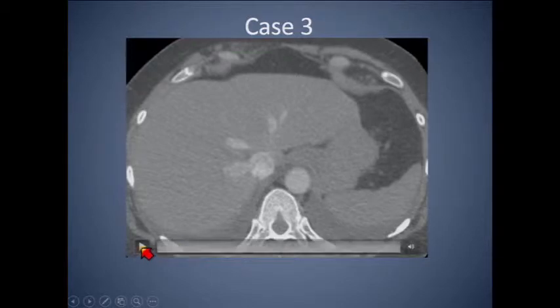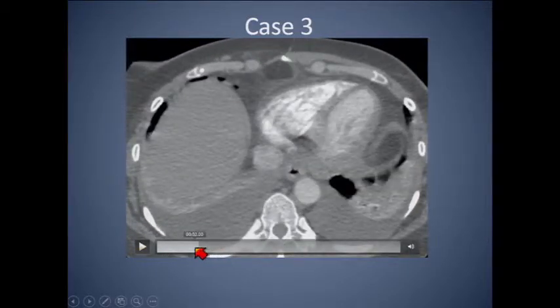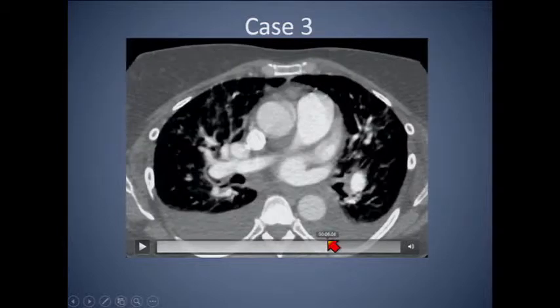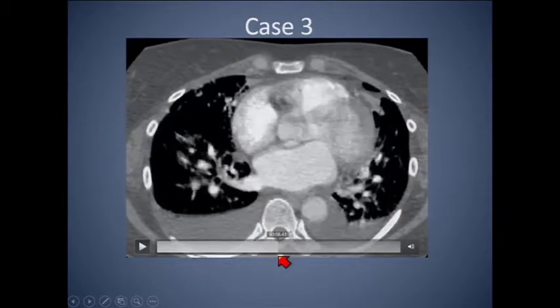So when we look at her CT, and we're going to hope this one works, okay. So in fact, it is not the world's prettiest PE. There's gross motion on it. We have a large amount of pulsation artifact involving the aorta and the pulmonary artery. She clearly has pleural effusions, clearly has perihilar airspace disease, which was probably her pulmonary edema. But nothing lives in between the left atrium and the aorta.